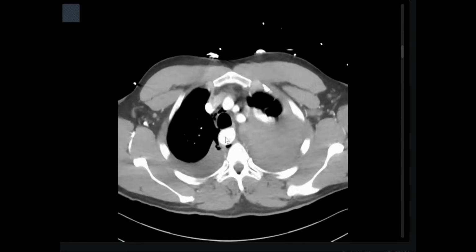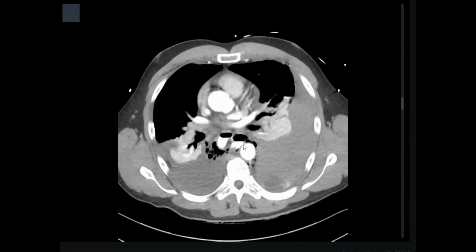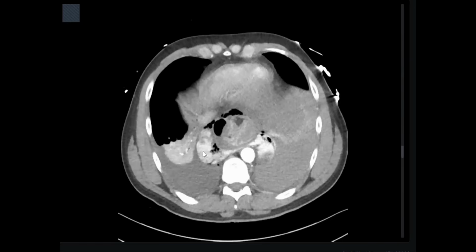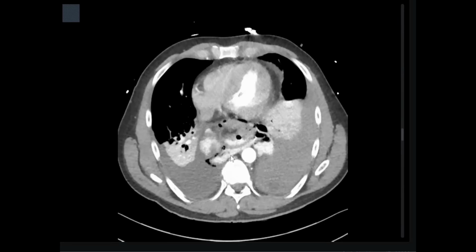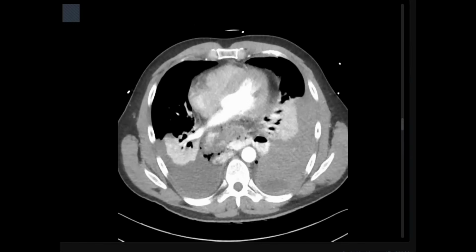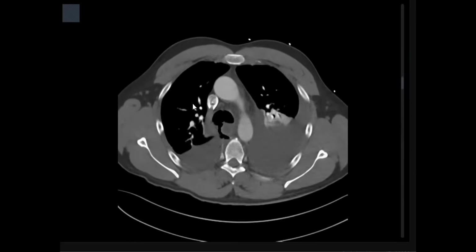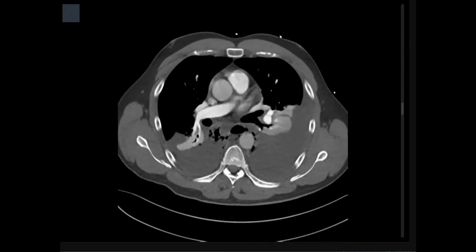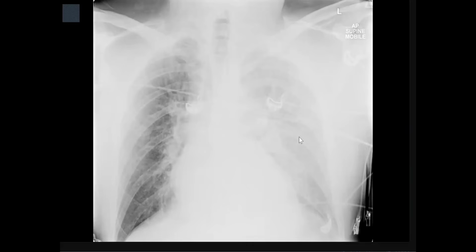You see here, oral contrast is noticed, then extravasation. It's Boerhaave syndrome. It's a definite case. Some hiatus hernia also is present. Sometimes vomiting, sometimes hematemesis. It's urgent, but the main finding will be a pneumomediastinum. A pneumomediastinum together with effusion. Here it's not classic, just effusion.